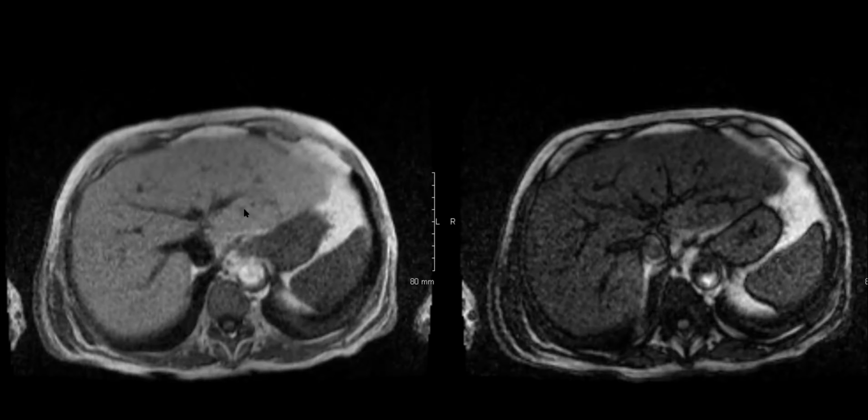All right, I'll just talk. You can see, first of all, visually, this liver is super duper bright in phase, which is quite unusual. It looks way brighter than it should be. When you compare the signal drop, it goes from being brighter than the spleen to being iso to the spleen. Obviously, we have all seen visual drops that looked way worse.